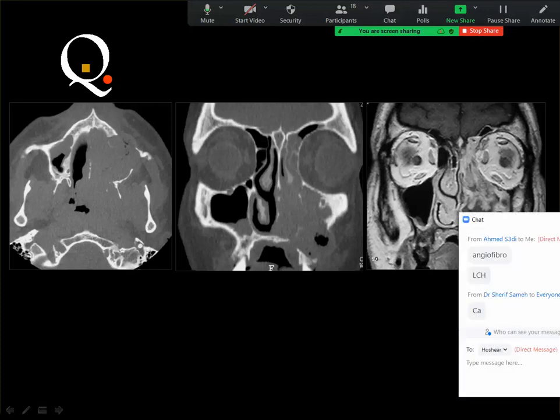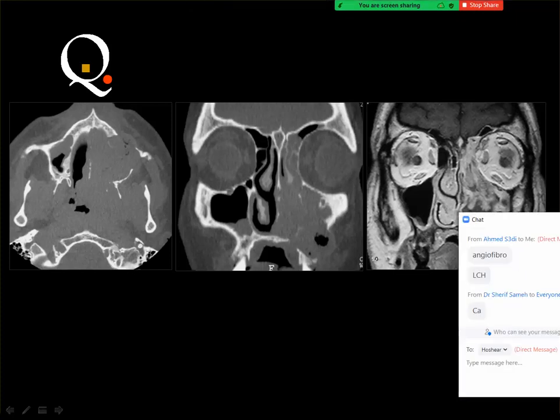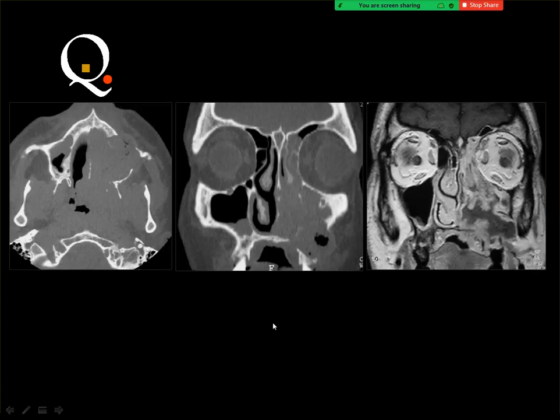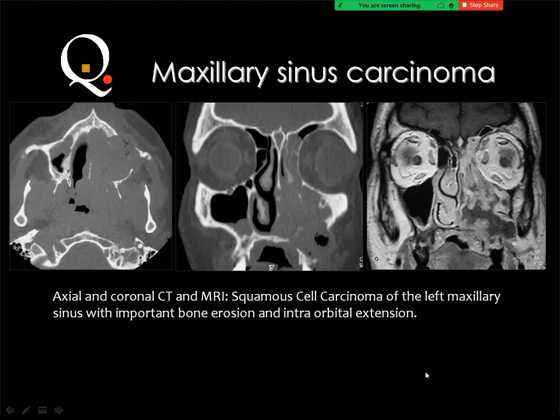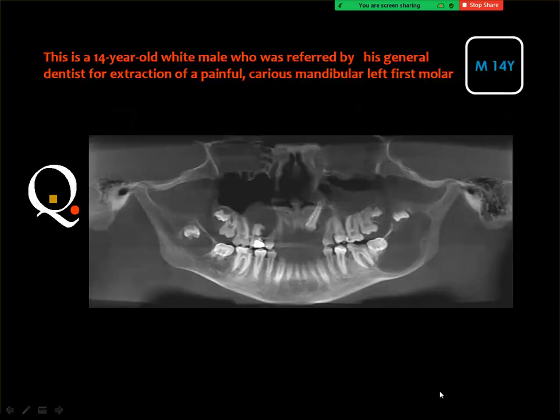Yes, you consider carcinoma. And if you feel that this is only an expanding lesion without bone destruction, you should revise your feeling, because there is significant destruction of the anterior wall of the maxillary sinus, the medial wall, the pterygoid plate, and part of the bony nasal septum. Then whenever you see destructive changes, first of all on top of the list is the carcinoma.